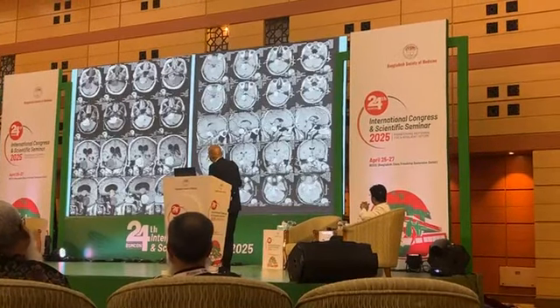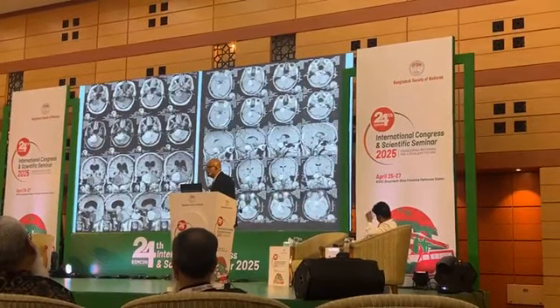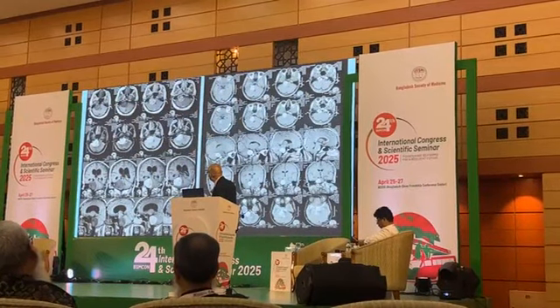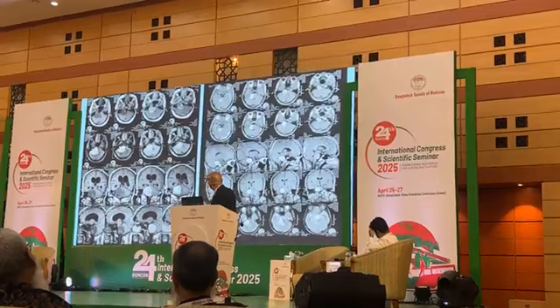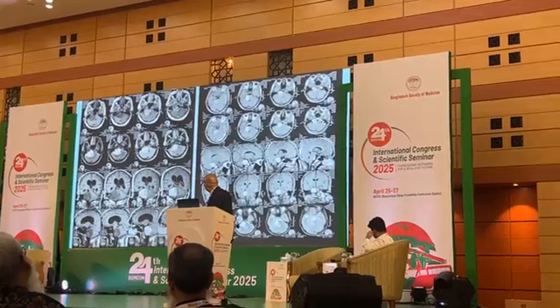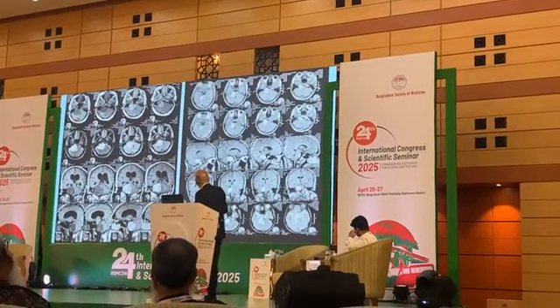But we see, especially in subtentorial sites, this is a space called cerebellopontine space, or CP angle, on the right side, on the left side. This is cerebellum, this is pons. This is T1, black lesion, contrast enhanced, T2 and FLAIR. We can see there is a lesion in the cerebellopontine angle, pressing pons and cerebellum. This is a CP angle tumor. Okay? Agreed?